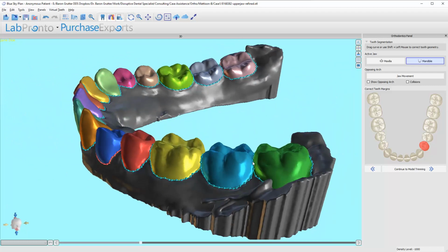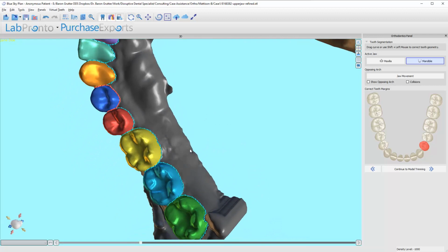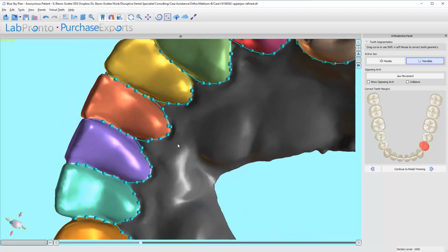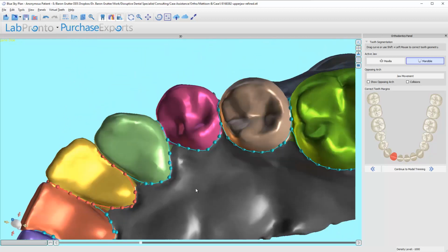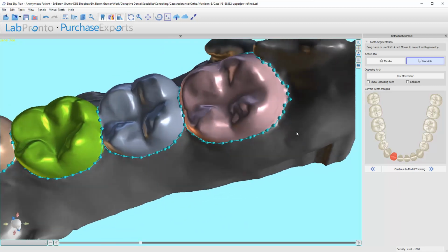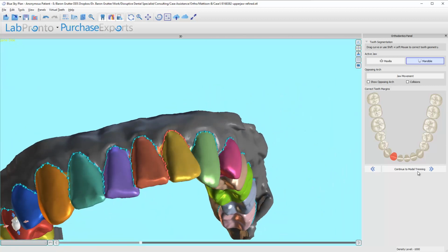I'm being pretty picky, but it's also not my case, and so I'm going to be a little extra picky with someone else's case because I want as predictable as possible an outcome for them. I probably wouldn't go through this much detail otherwise. All right, there we go.